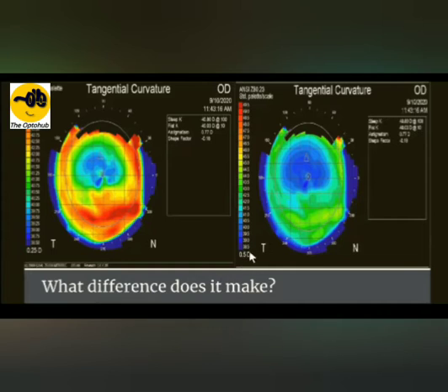Another thing is that this is increasing in 0.5 diopter steps. On the left side, you see it's in 0.25 steps. So the 0.25 steps are going to give you more detail about the cornea as compared to the 0.5 scale. Although it has got a longer range, this longer range is useless because this patient does not have a steepest K of 49.5. So regardless of the cornea, it doesn't matter how steep or how flat the cornea is, it will still use this scale only.